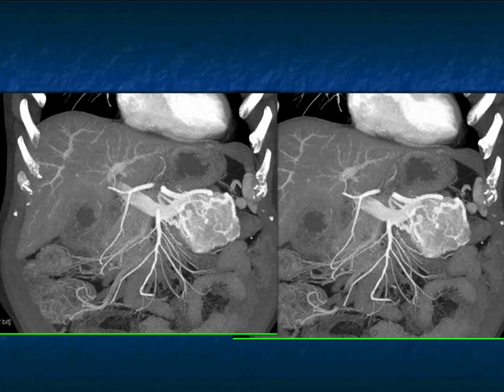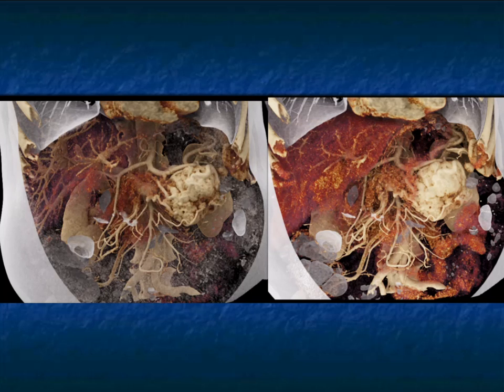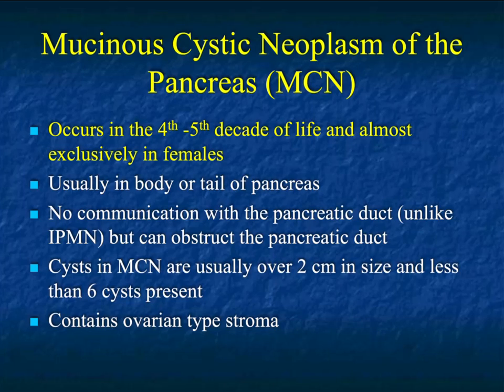Another case here, and we'll stop after this case: a vascular lesion, incidental finding, solid mass. First thing you think about is a neuroendocrine tumor, vascular, but then you look, there's draping of vessels, and here's the lesion on venous phase. It begins to wash out, and I see all sorts of septations. Here it is on the cinematic where you really see the lobulations so nicely. And again, here it is showing you the multiple septations. This has the look of a serous cystadenoma, not a neuroendocrine tumor. Both were hypervascular, so there is that branch, the solid serous cystadenomas, which can indeed be very vascular.